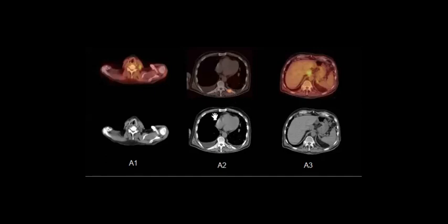osseous involvement, yes. And I see that there is bilateral pleural effusion, but do you agree with me that there is no uptake in this pleural effusion? So maybe it's not metastatic, right? But this high uptake could be metastatic, yes. I know that a fracture sometimes shows this, but it can be metastasis as well, especially as this is not a usual site for fracture.